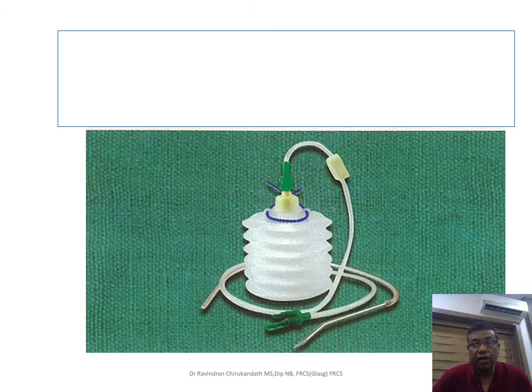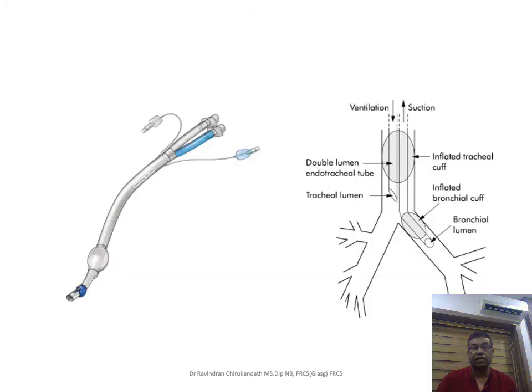These are suction drains used for surgeries which are superficial, especially the breast, thyroid, superficial surgeries like hernias, varicose veins, or any surgeries where there are dissections in the superficial tissue. Very rarely used in cavitary surgeries.